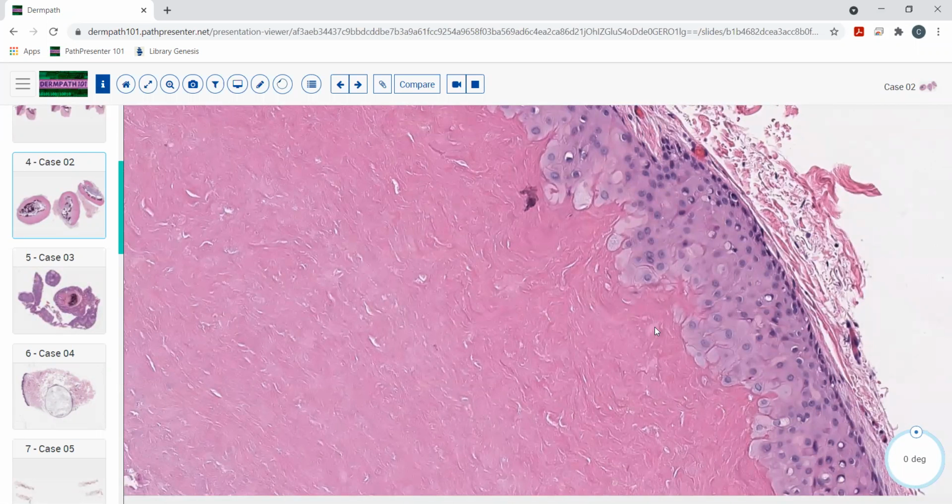You get this markedly thickened, glassy basal membrane zone at the outer periphery of the follicle as it's collapsing in on itself. So he said, well, that kind of looks like the catagen stage of a follicle, and it's at the isthmus kind of area. So it looks like the isthmus of the follicle, but also looks kind of like the catagen stage of the follicle. So he called it an isthmus catagen cyst, which tells you a little bit about the lining of the cyst.